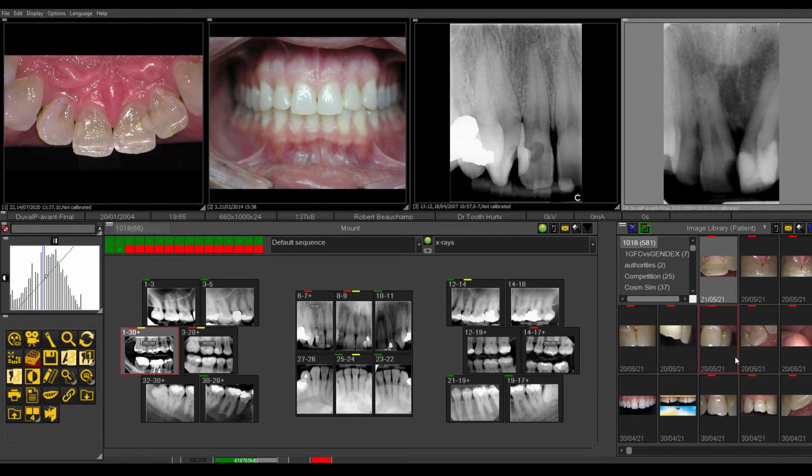It's sort of like that background database of images where everything is stored. So this is where Robert Beauchamp images, every single image I've ever taken is going to be stored here. You won't have these subfolders. I've done this for personal demonstration reasons. You will just have this with the amount of pictures in that folder and all saved.